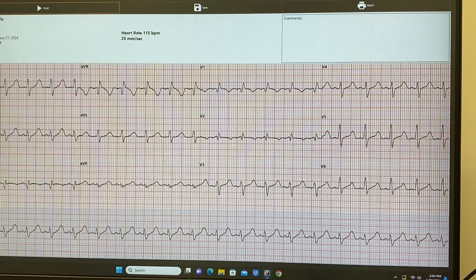Is there an irregular rhythm? Let's see.